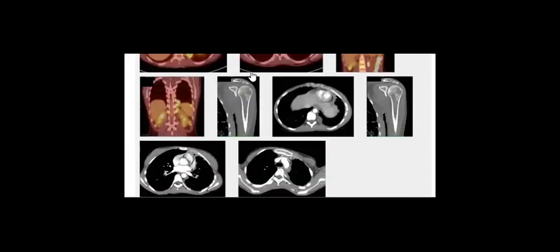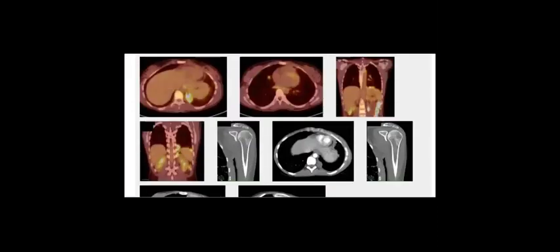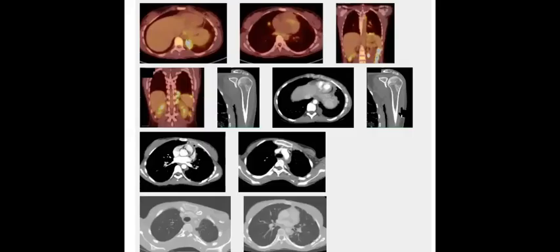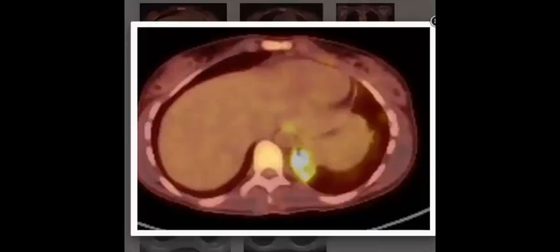Okay. So let's go to this case. Let's start with this image. What do you see here?